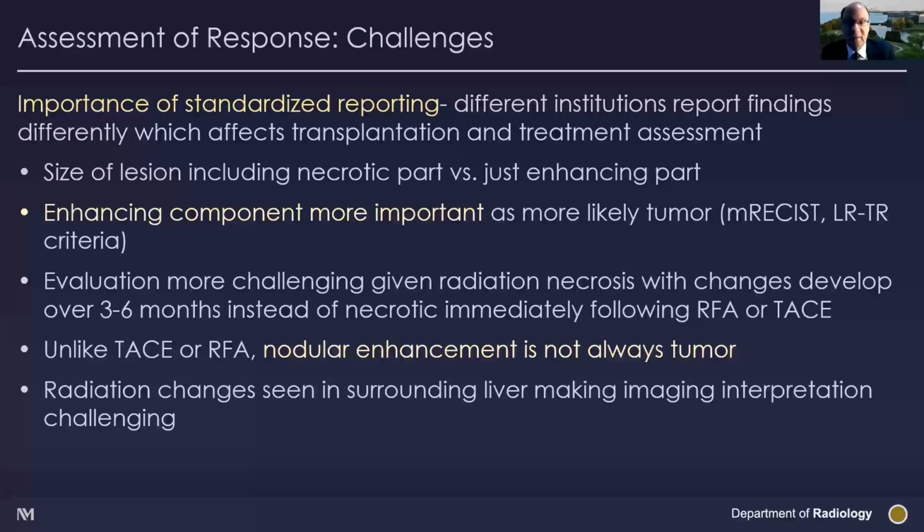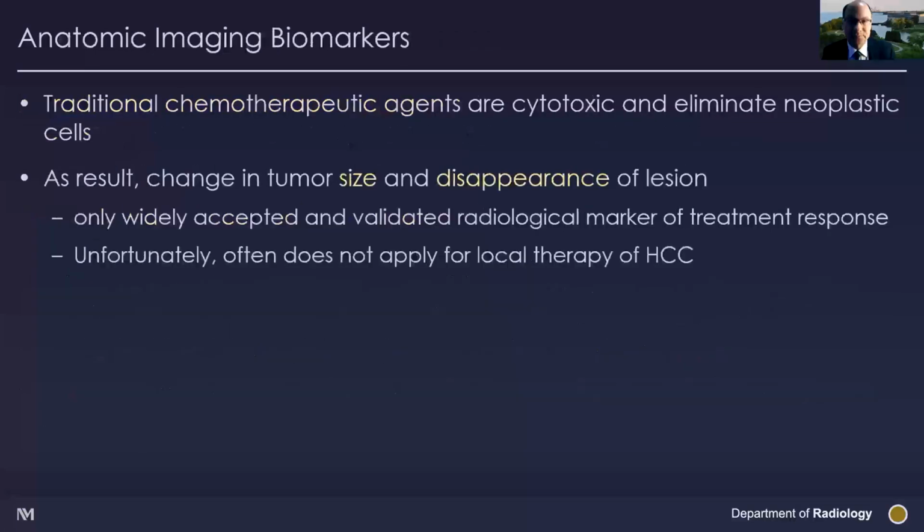It's also important to recognize that evaluation is especially challenging given the radiation necrosis, with changes developing over a period of 3 to 6 months instead of being necrotic immediately following RF ablation or chemoembolization. In addition, unlike chemoembolization or RF ablation, as I mentioned before, nodular enhancement is not always tumor. And I'll show you some examples where, if you had thought that the nodular enhancement was abnormal, you may be mistaken, because it's not always tumor, or maybe tumor that takes a longer time to respond. Also, another big challenge is that you see radiation changes in the surrounding liver, making imaging interpretation challenging.